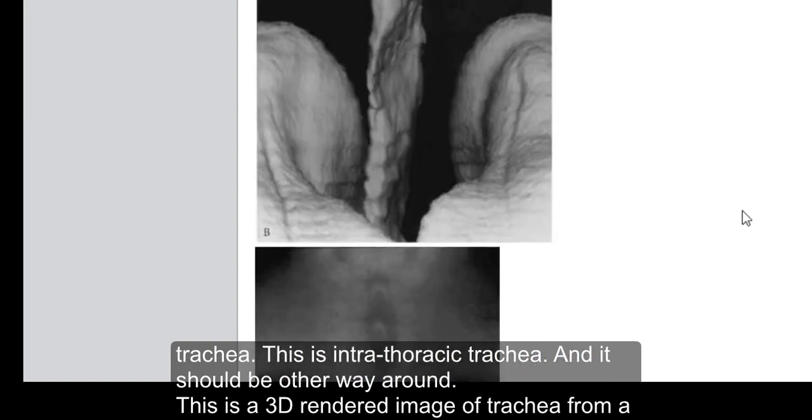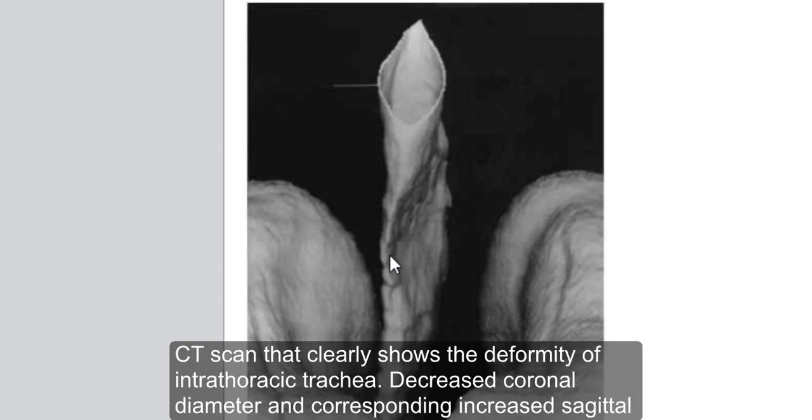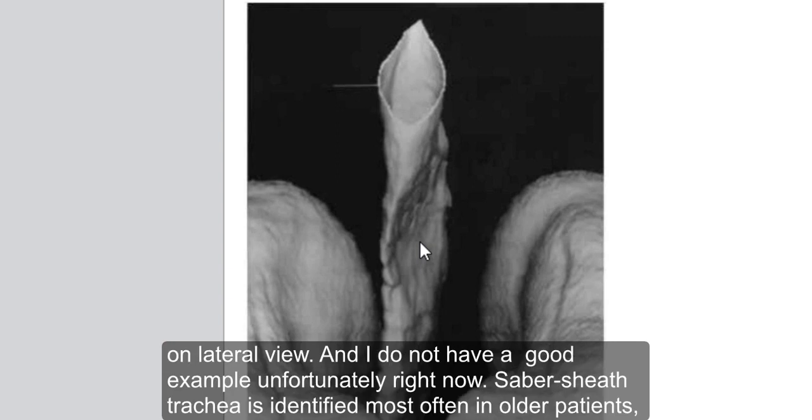This is a 3D rendered image of the trachea from a CT scan that clearly shows the deformity of the intrathoracic trachea, decreased coronal diameter, and corresponding increased sagittal diameter of the trachea. This deformity leaves patients extremely debilitated, unable to breathe. And so once again, Sabre sheath trachea sign refers to marked coronal narrowing of the intrathoracic trachea on frontal views with corresponding sagittal widening mostly visible on lateral view. And I don't have a good example unfortunately right now.